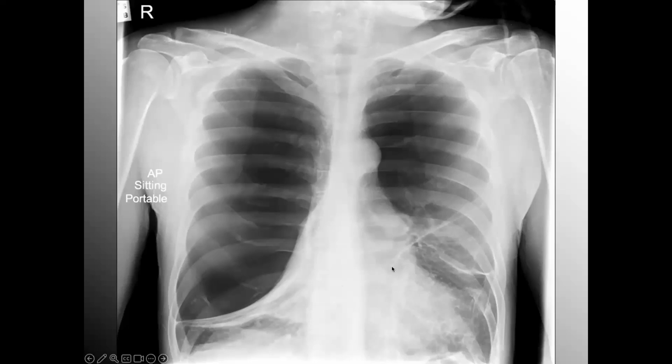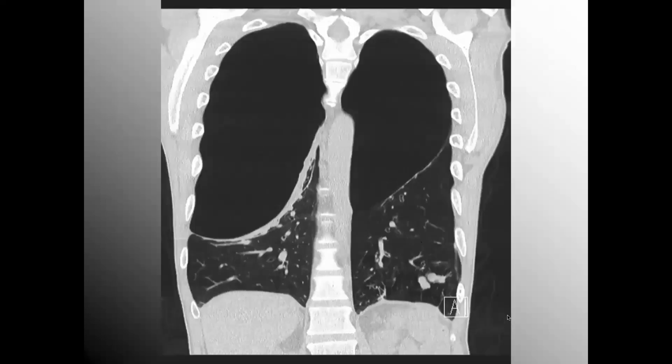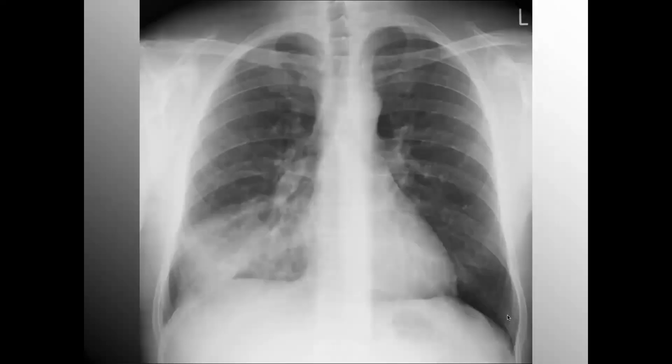What I am seeing is infolding. So all of these darker lines, these are not ribs. This is infolding of lung tissue, where you have overlapping of tissue that happens in layers and creates an increase in radio opacity or an increase in density. Those are just little things to pick up on. It takes practice, but if you're systematic, you won't miss a whole lot.